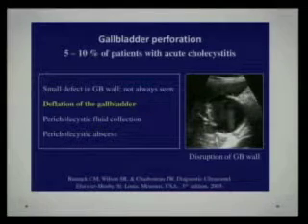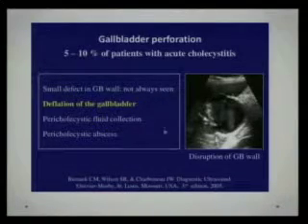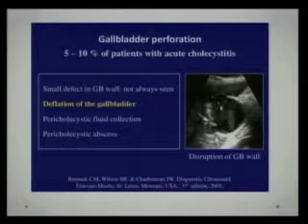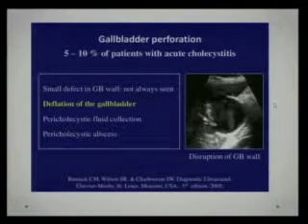In this patient, this is the echogenic gallbladder wall. This was a focus where there was no gallbladder wall. This was a focus where there was no gallbladder wall. And there was extrusion of biliary contents, maybe pus, coming out of the gallbladder lumen. And this was the area of disruption. Probably, was this an area of disruption? I'm not sure if this was a gallbladder wall or not, but here it looks like this could have been another area of disruption.